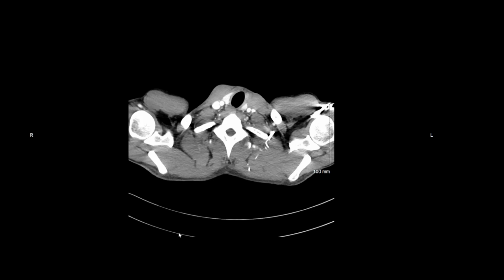Hello, my name is Joseph Owen, and in this screencast, we will be reviewing a standard search pattern for chest CT. When I start reviewing a chest CT, I tend to start in a standard soft tissue window. In this case, my window is 315 and my level is 45.